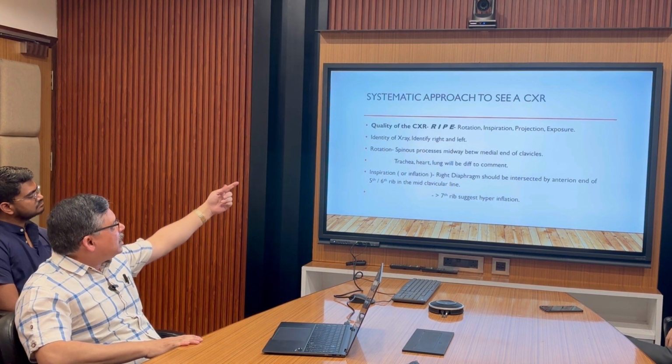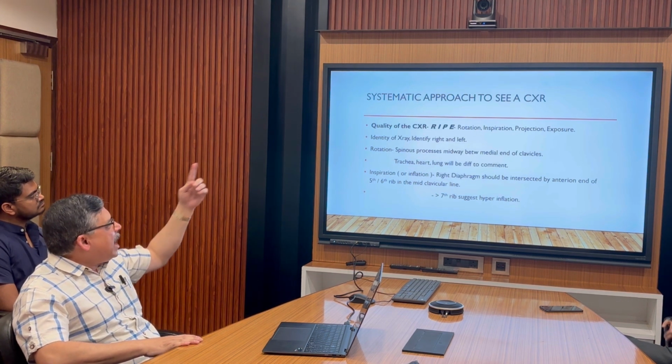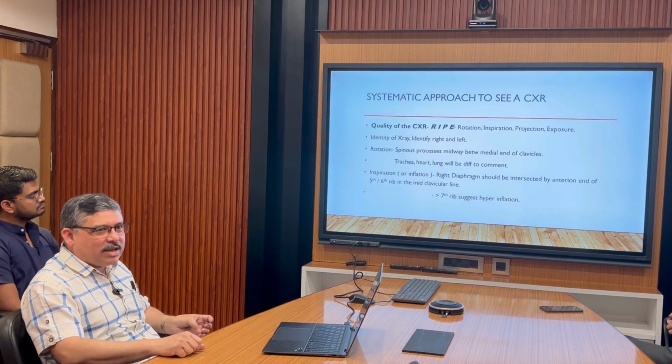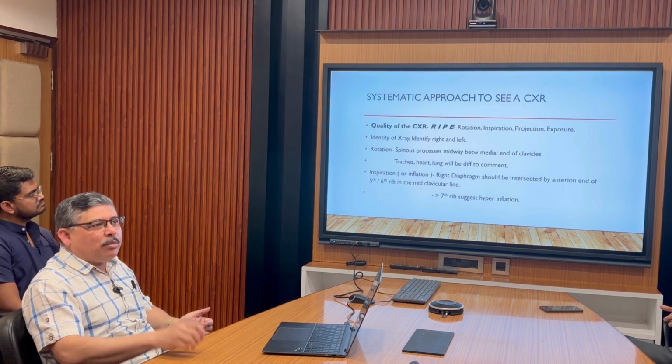So the first thing, the second, I should have put that one on the first: the identity of the X-ray. You should always see whose X-ray you are seeing. Otherwise, you may end up seeing somebody else's X-ray. That is the most important thing. Identify the right and the left.